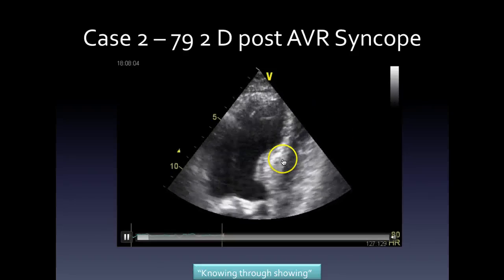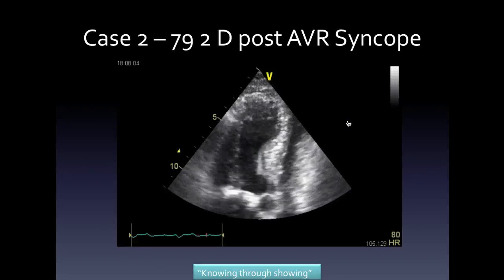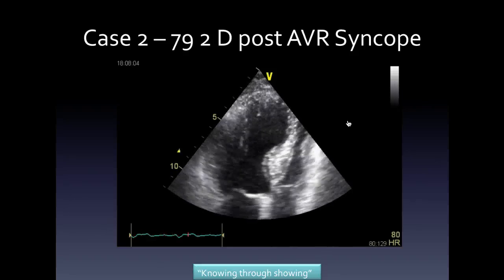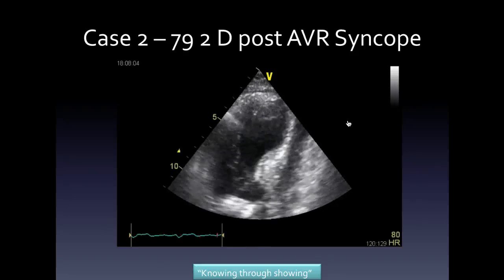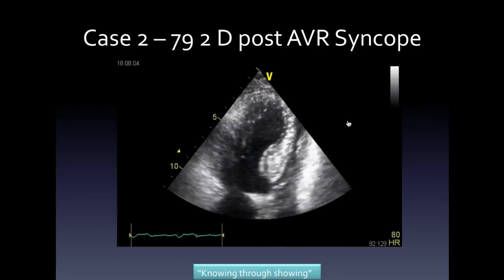There was a whole disease called hypertrophic cardiomyopathy of the elderly back in the literature, which thankfully we don't talk about anymore. I won't say it's normal, but it's commonly seen to have quite a hypertrophied septum in older folks. So it looks like HCM, but it's not, it's just a sigmoid septum. So he's got that curveball.